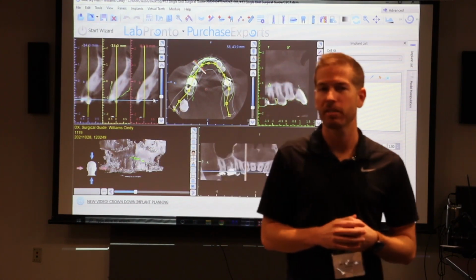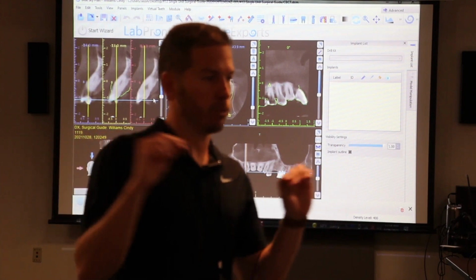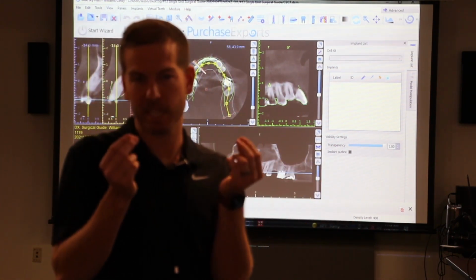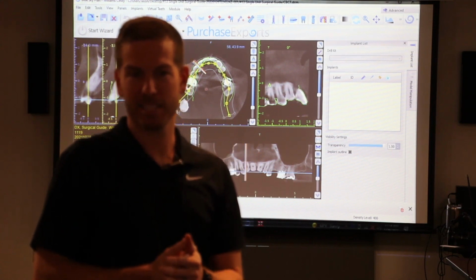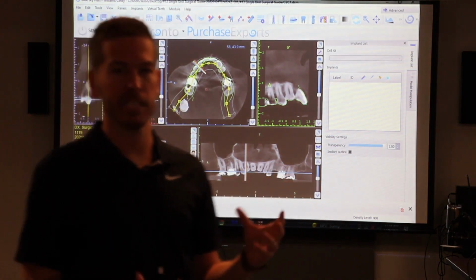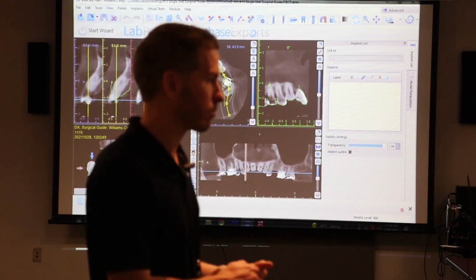Yeah, for the denture you have to dual scan. So you have to put some sort of radiographic marker on their denture, like glass beads or composite or gutta percha, and scan the denture separately. Sometimes your CBCT has the ability to scan that thing. That's a common one.